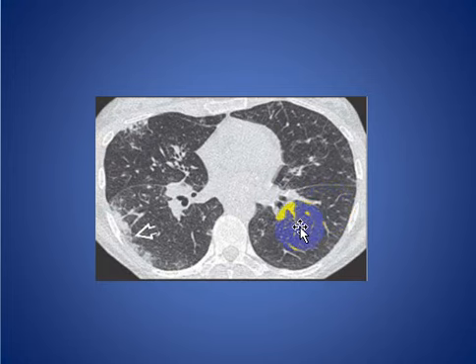Here, another patient with axial high-resolution CT scan showing subpleural consolidation due to vasculitis in a patient with Churg-Strauss disease. The patient has asthma, and commonly this is a coexisting condition.